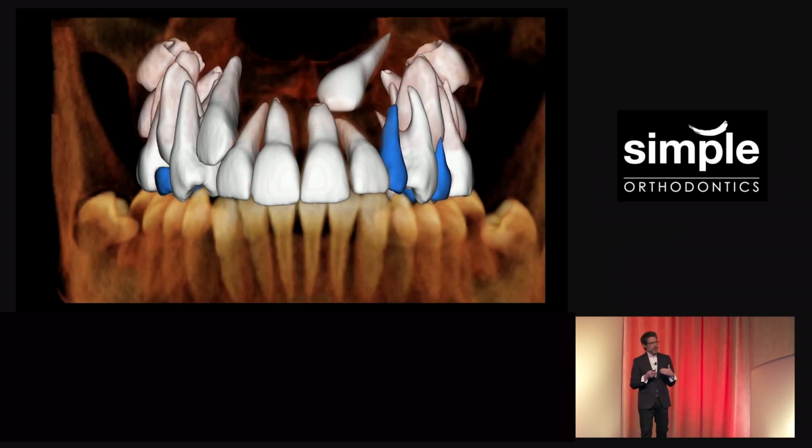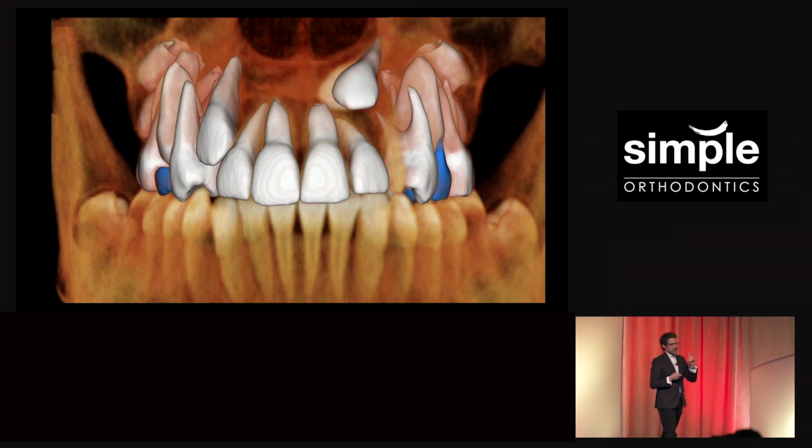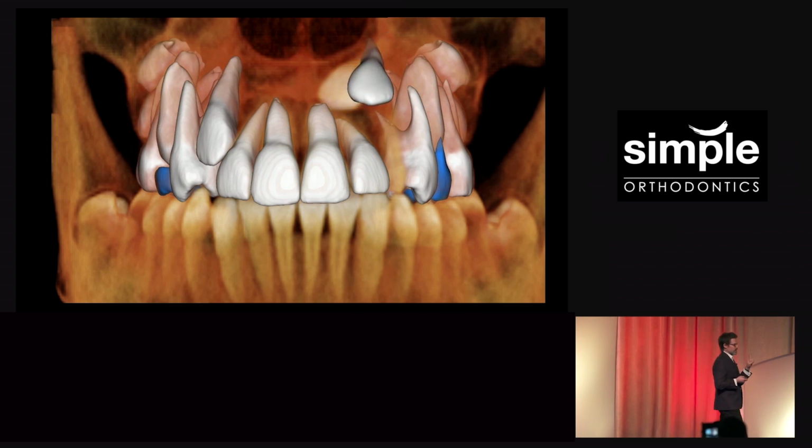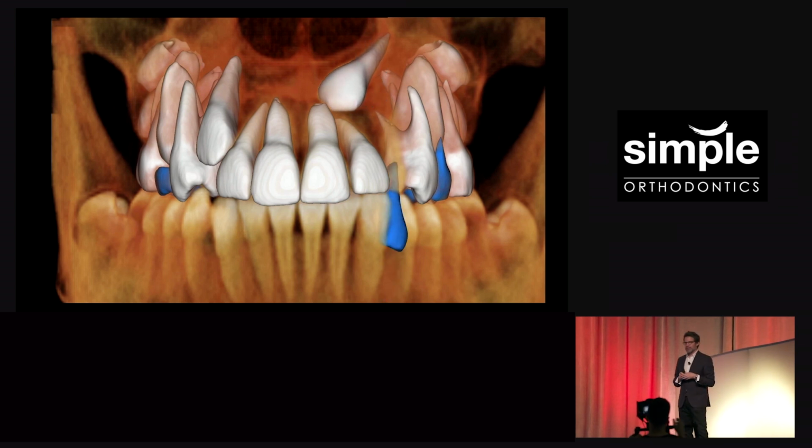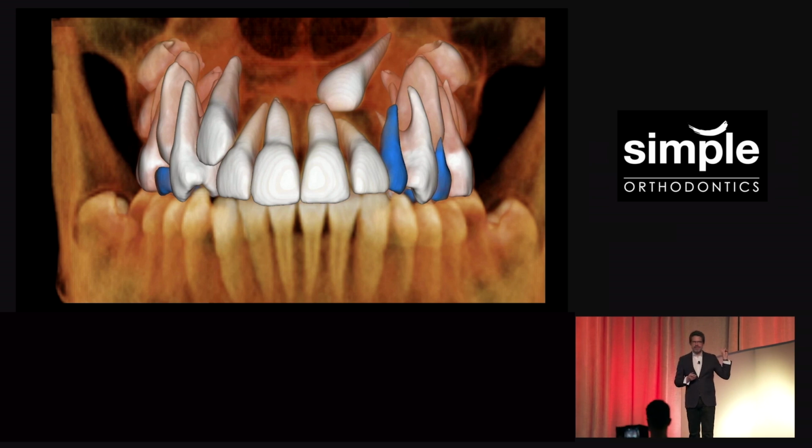Most surgeons are quite conservative. I only use 2 oral surgeons. And both of them are mandated that they use 3D technology. I won't send to a surgeon that wants a pan because they can't see this. They can't see this bone, and I need it.